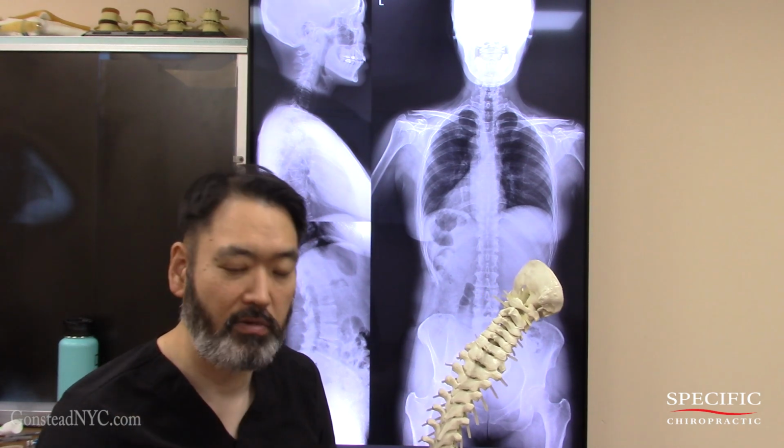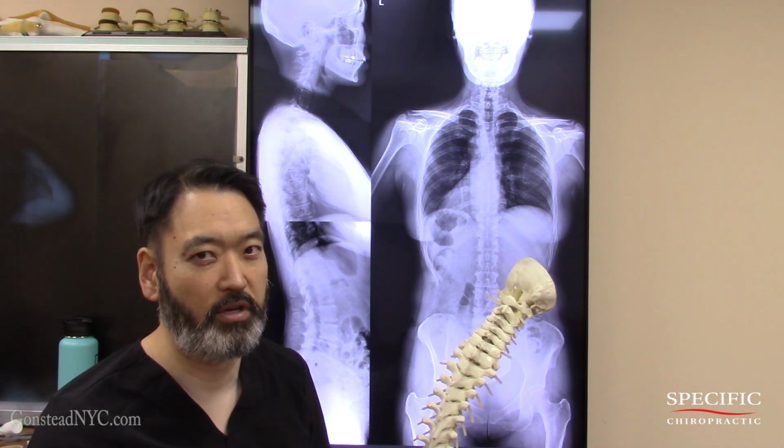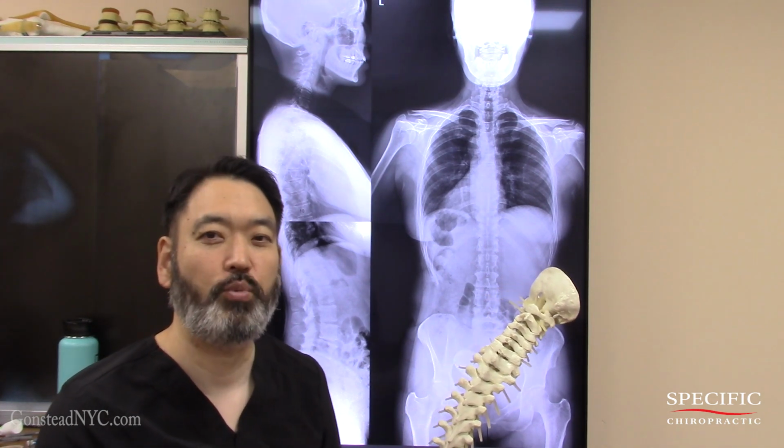The patient said, hey, it's completely fine, no problem. That's how we found the exact number on that patient. 7 millimeters is a sweet spot. That's what this case is all about.